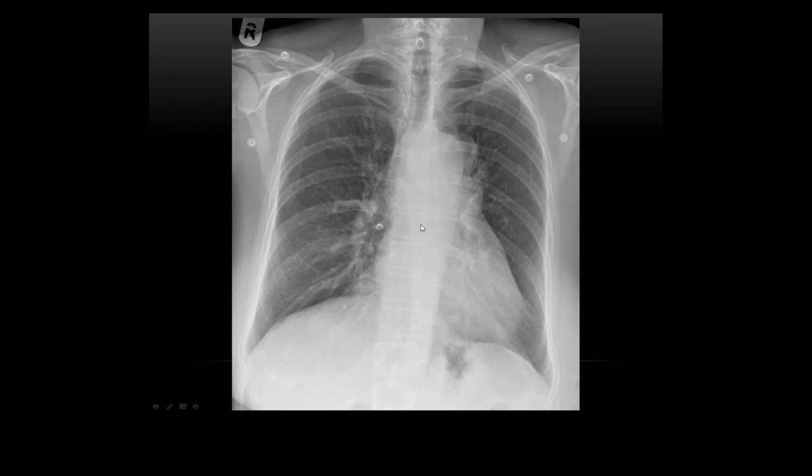Yeah, good. So if you look at your spinous processes, the distance to the right sternoclavicular joint compared to the left, it is widened, so that is rotated. That is within acceptable limits. So think about the silhouette sign and what we've just been talking about, your review areas.